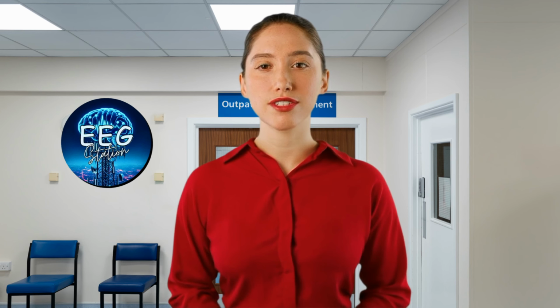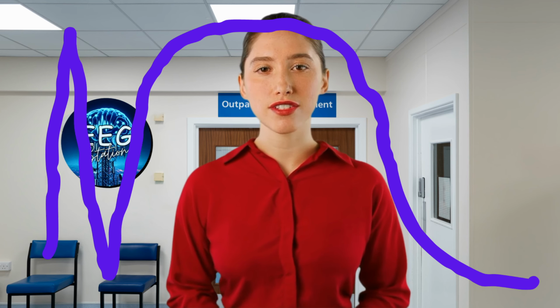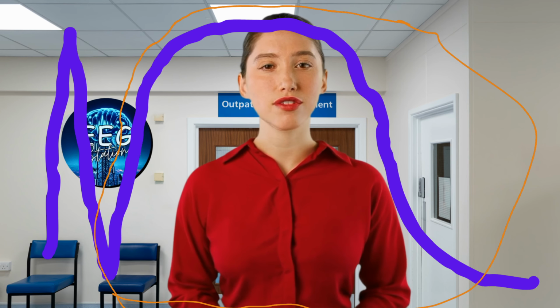Our topic for this video is investigating what effect, if any, would a low-frequency filter setting of 3 Hz, that is a time constant equal to 0.053 seconds, have on a 3 Hz spike and wave complex, in particular the slow wave component. We should also observe what effect, if any, such a filter change has on the spike components.